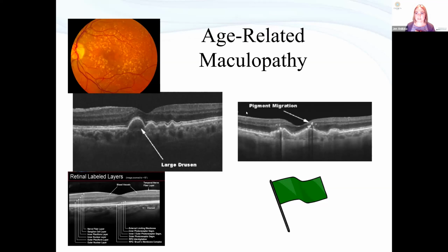You just have to at some point put your foot down and say, is this likely to be significant? And this is not likely to be significant. If this was a larger pocket, say it was sort of 3 times as large, you might think it was significant, especially if it was new compared to a previous scan. But this tiny thing, this is probably just the draping of the layers over that lumpy, bumpy PED. So you just make a judgment call. This is what we do. There's no magic in it. We just make a judgment call. Is this likely to be significant? Or is this just sort of an artifact of imaging? Is this just an artifact of the anatomy?